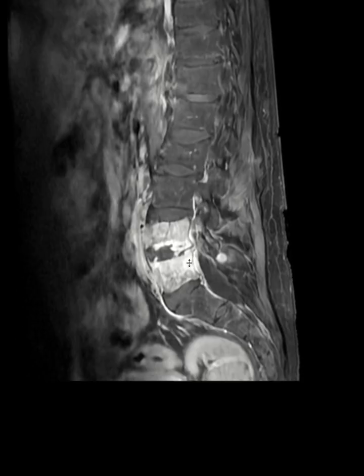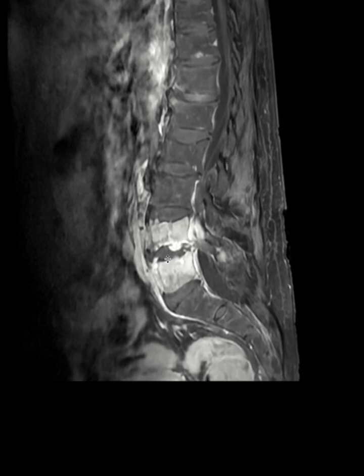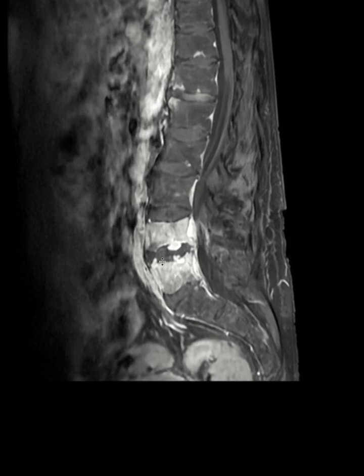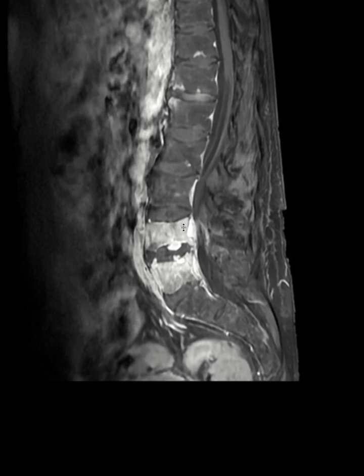So the important or pertinent positive things we have to discuss. First of all, we have to say if this is a Discitis Osteomyelitis or not, which is basically it is. And the main differential is modic type changes, or basically degenerative inflammatory changes, but this is very different. The way it is different is when you have infection and discitis, you have infection or inflammation going beyond the osseous structure. So you have extra osseous involvement. As you see here, we have extra osseous involvement of the soft tissues in the perivertebral soft tissue, and you have epidural involvement.